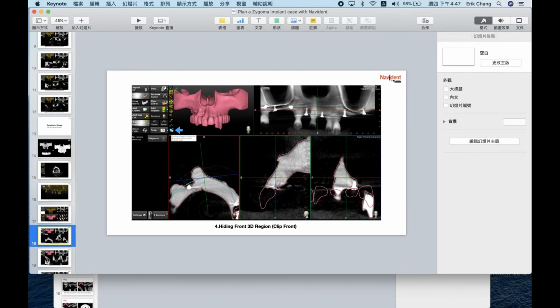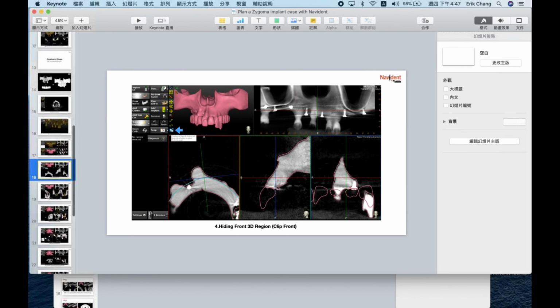Now this is the second solution. I separate two parts. First is the surgical-driven one, with only the CBCT and without the prosthetic STL. So the first part applies when there is no diagnostic setup.